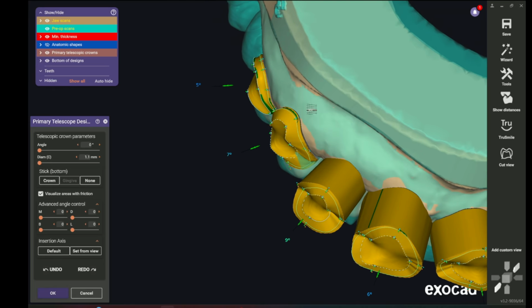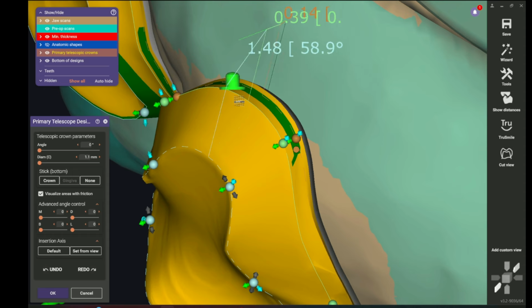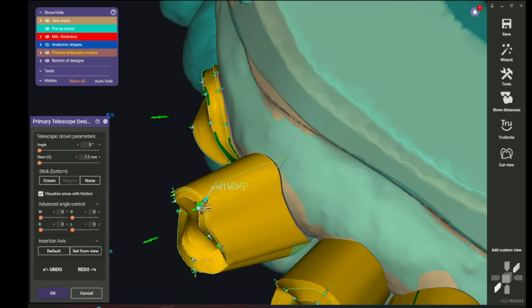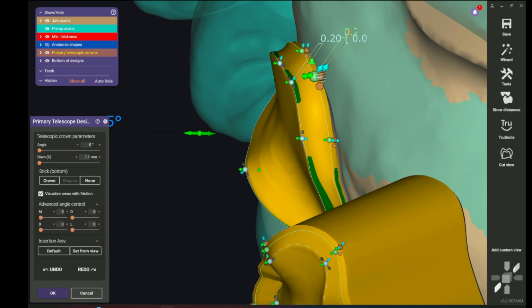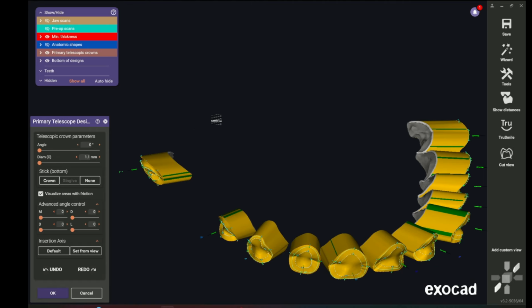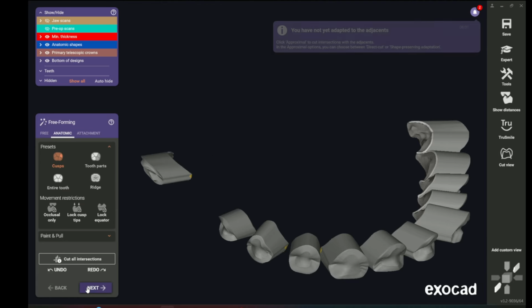Okay. Same thing, we'll zoom in. There's the front line, and we'll go back to this back line. So it's this arrow here. Control, click, pull it out. Just like that. Finish this out. Grab that one, Control, pull it out. Now once you've done that, we're just going to hit OK. Go to the wizard. We'll hit next, next, next.